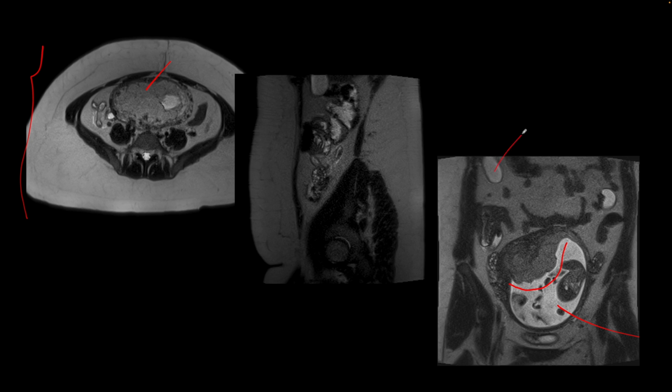We can see that the gallbladder here is normal, and the appendix is seen right here. It is enlarged and there is some surrounding fat stranding. All of these white linear foci that are seen around the distended appendix, that's fat stranding or signs of inflammation. And here is the ostium showing an appendicolith obstructing the ostium of the appendix, leading to acute appendicitis.